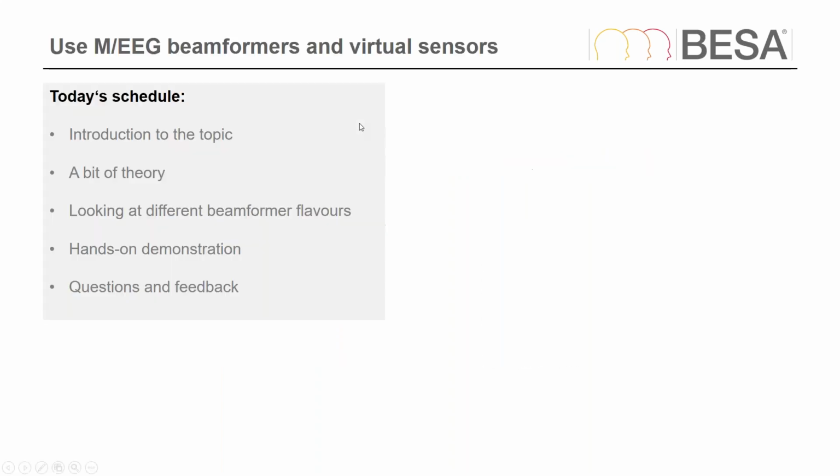So, what's on the schedule today? First of all, we are introducing the topics. Then we will look at a bit of theory. Then we will see the beamformer in action and try out different beamformer flavors on some data, using the BESA research program as a vehicle.